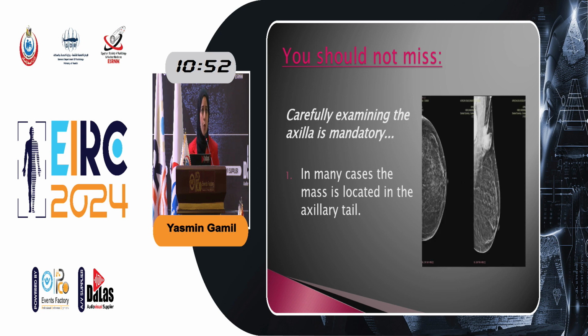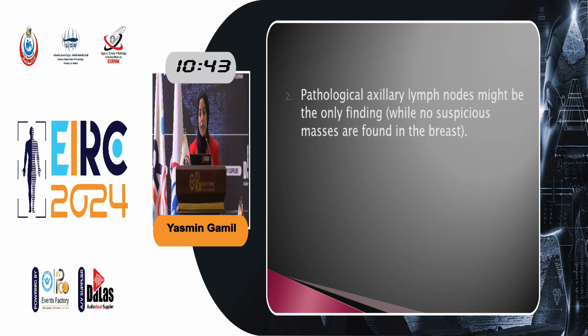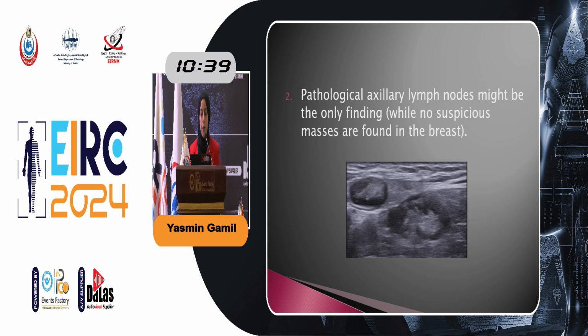Therefore, proper interpretation of the MLO view and proper evaluation by ultrasound is very important. Pathological axillary lymph nodes might be the only finding, while no suspicious masses are found in the breast. Therefore, further studies might be recommended.